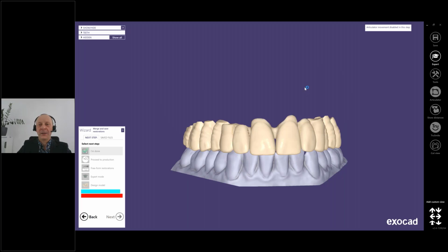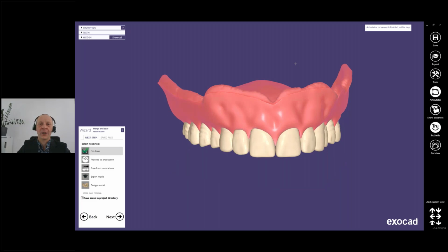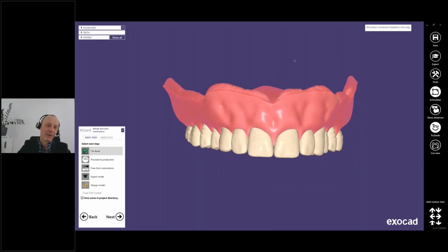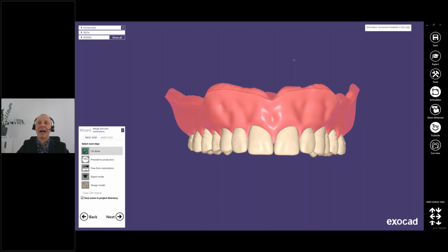This is a very good sample of why I generally do not recommend working with a laptop. I work with a laptop, a pretty powerful laptop, but it still calculates not as quickly as a normal desktop full workstation. So, save scene in project directory.